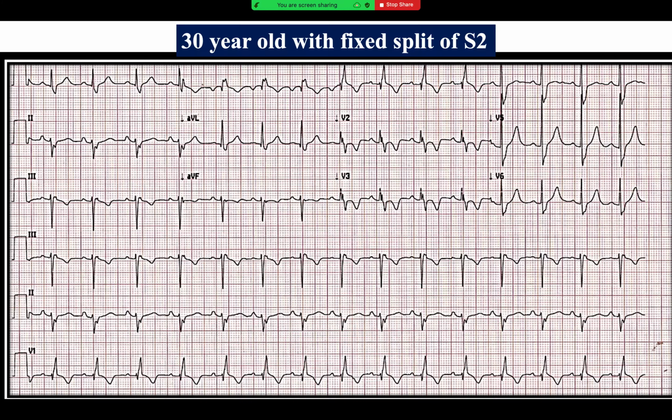Another patient, ECG in front of you. Come on, rapid fire. Quick, quick, quick. Sinus rhythm is there. Axis is left axis. What else do we notice? Right atrial enlargement is there. How about the PR intervals? You can call it like a trifascicular because there is a right bundle branch block with left axis deviation, and PR is also slightly prolonged actually.